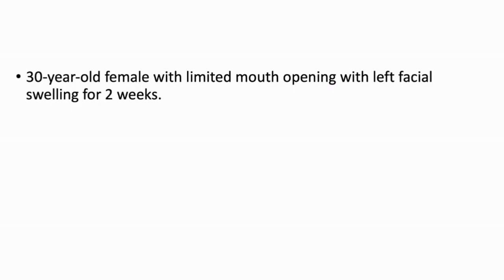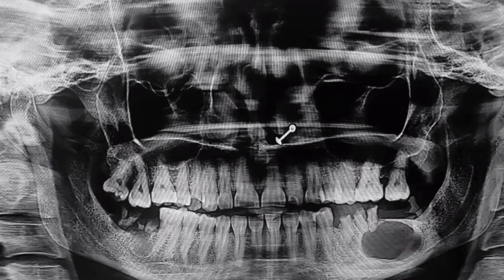30-year-old female with limited mouth opening with left facial swelling for 2 weeks. Okay, I'm provided with an OPG. Here I can appreciate a large, well-defined, lucent lesion identified within the body of the mandible.